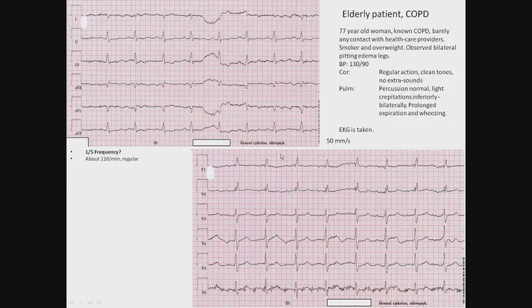And this means that we address the morphology or shape of the QRS complexes. And here we see kind of an M shape in these right precordial leads, V1, V2, which indicates that it is possibly a right bundle branch block here. Because we see there's no such change on the left side of the heart, and this noise you see along here is just a measurement disturbance.